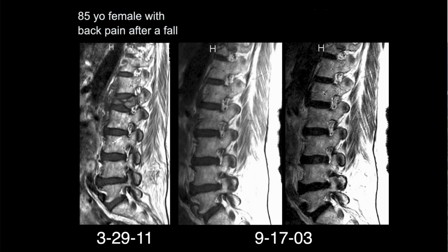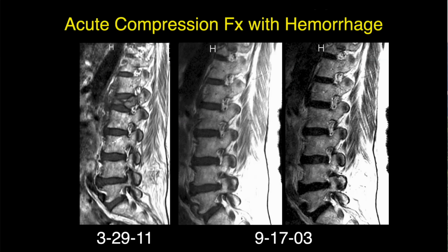At one time it was intact. So that just shows that was an acute compression fracture, and it was just hemorrhage around it.